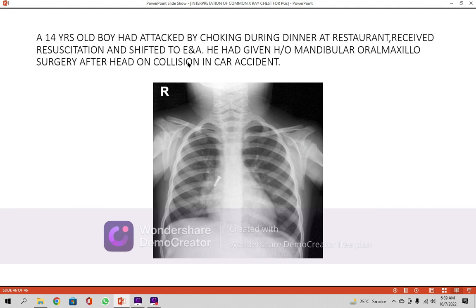As far as dental processes are concerned, as an implant, they are using screws in them. Now this screw is this. A screw can be detached by the chewing mechanism. In about 5 to 10% of cases it can come out, although there will be no dislodgement of the implant. This screw will strengthen it.